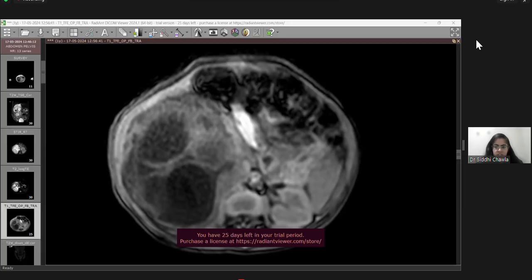On ultrasound, it was a solid mass, and on CT, we could see that the mass was solid with multiple chunky calcifications in close contact with the posterior mediastinum and the paravertebral soft tissue. The differentials in our case were mediastinal neuroblastoma, germ cell tumor, and inflammatory myofibroblastic tumor, and it turned out to be a mediastinal neuroblastoma.